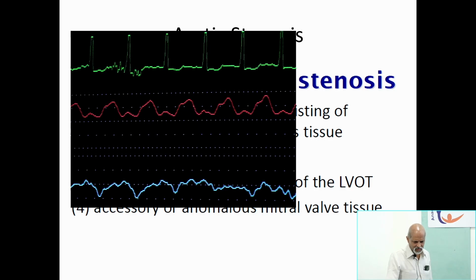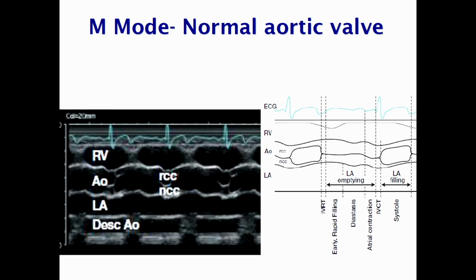So there is a little bit of a case. She was a young girl. If you look at the aortic arterial trace, it almost resembles aortic valve stenosis, but the actual thing was something different. Sub-valvular LVOT lesions can mimic aortic stenosis when the aortic valve is actually normal. But in that case, because of the gradient at the LVOT, the aortic valve will have aortic regurgitation, because there is a lot of turbulence under the leaflets and a possibility that the leaflets get sucked in at that time.